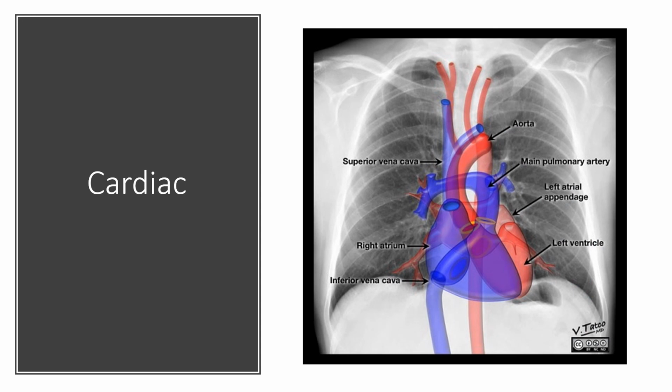Cardiac. A, B, so apices, we looked at the top of the lung. B, we looked at the bases, we looked at the costophrenic angle. C is cardiac. I want to see my moguls, right? I want to see my aorta, my pulmonary artery, and my left ventricle. Those are my 3 moguls, right? You could even draw a little skier going down these moguls, right?